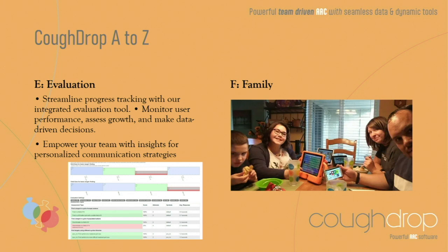Then for family, this is my favorite, and this was my CoughDrop aha moment. When Forbes purchased CoughDrop over a year ago, we sat down and met with the developers of CoughDrop, and this picture for me is what makes sense about CoughDrop and why it's so unique. When I come in here and I see all the family members using different devices but using the same language as a valid form of communication, this is everything that we want, right?